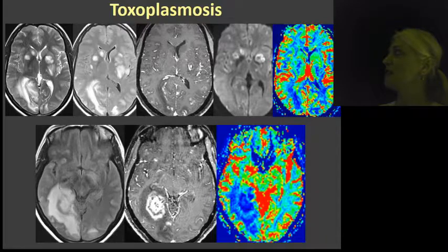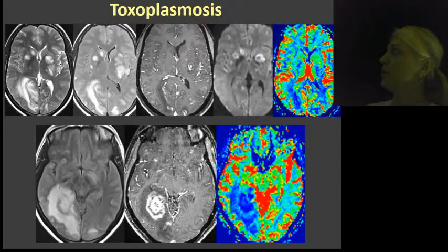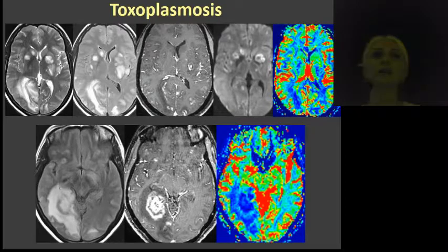And this is such a case. You see multiple lesions, and sometimes you think this could be anything. So you need a few keys. When I'm saying something is toxoplasmosis, it's when I see target-looking lesions, like this one, having almost several layers. This one is a real typical target, this one is atypical. Perfusion, of course, will be negative because it is an infectious lesion.